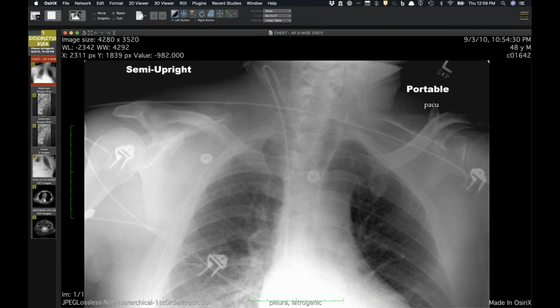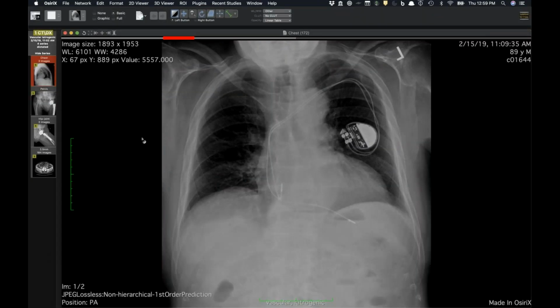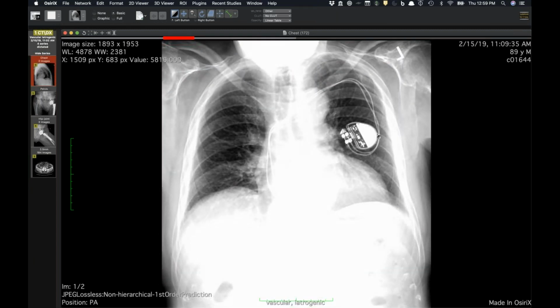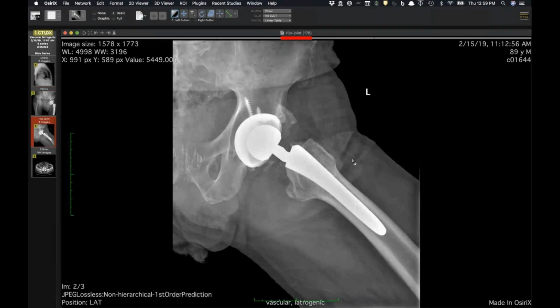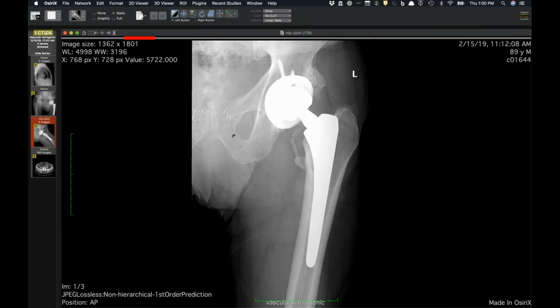So that was kind of just a quick one. And then this one happened to be a coincidence. This patient had a chest x-ray. He was an outpatient, and one of my residents was looking at this. The clinician had called to look at it, and I happened to be looking over his shoulder, and the first thing the resident looked at was the pelvis and hip x-ray. And I noticed this, which had just been described as a catheter, on the hip x-rays, which we weren't reading. And then you look at this and see this thing looks like it's in the femoral vein.